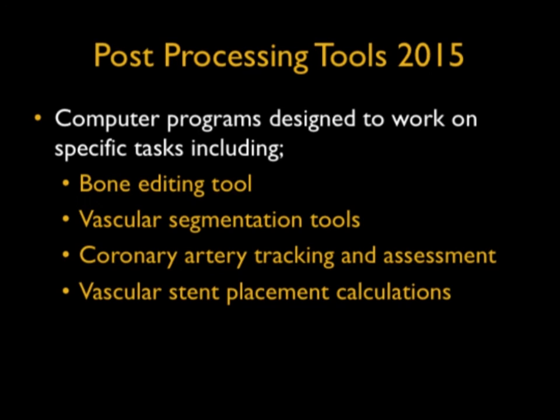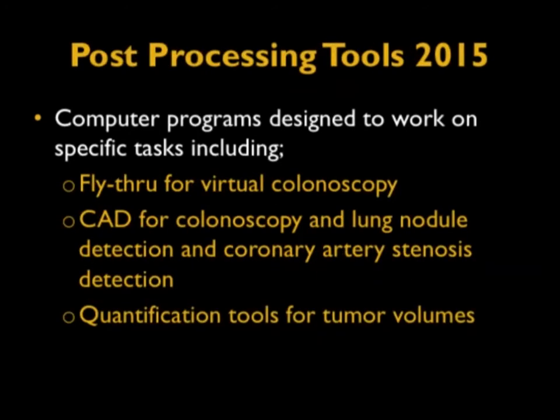So we have tools for bone editing to segment out the bone. We have vessel segmentation tools to pull out vessels or track specific vessels like the coronaries. We have ways of looking at stenosis in the coronary and grading them. We do stents, TAVRs, for example. We do all sorts of measurements, and the computer can assist us in making the correct measurements.